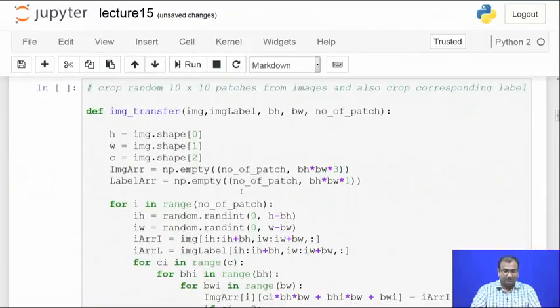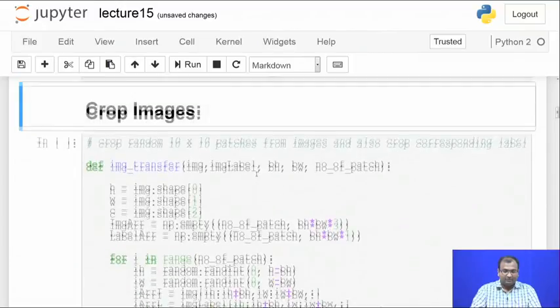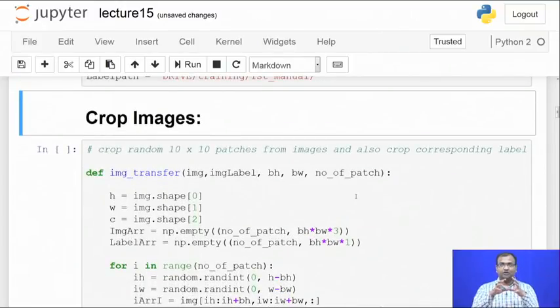label path, which come down to me. Now here my objective is that I model the whole problem as something of this sort, as you had done in one of the lectures where I was also mentioning this problem. One pixel can be considered as some sort of dependent response based on its neighbors. For me, let me take say 10 cross 10 sized patches, and whatever is the central pixel, that central pixel's label is what is associated with these patches.